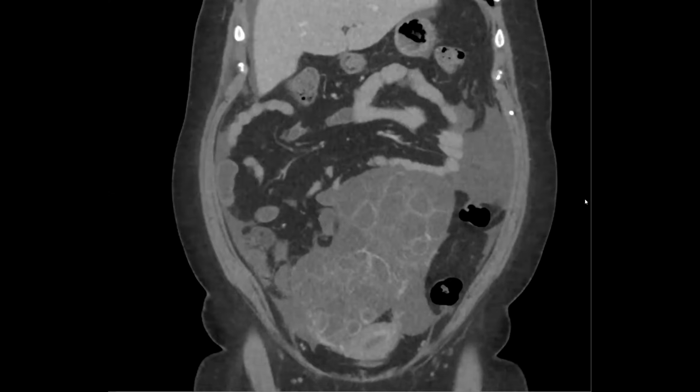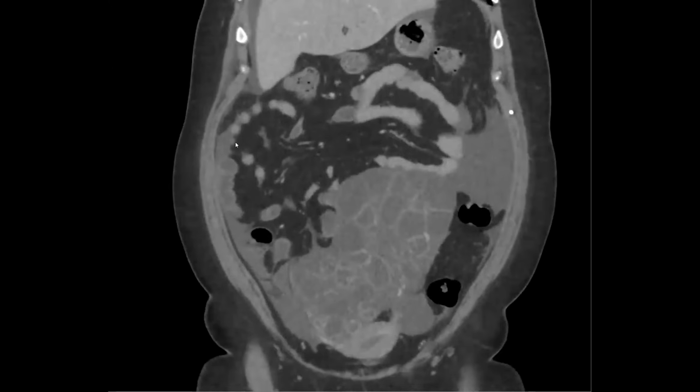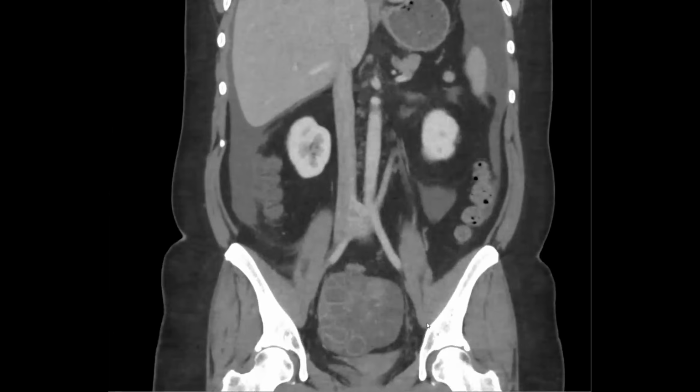I don't know if that, or they just suck out a bunch of fluid and then hopefully they retrieve it. Oh, wow. But yeah, the follicle itself is not the egg. This whole thing is not the egg. And this was actually after egg retrieval. So there was still a lot of fluid left over.